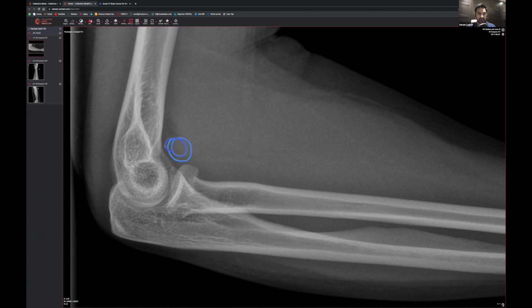But in this particular situation, it's almost undeniable that there is some elevation of some fat, and there's some high density material located here. Now, the other thing to understand is that there is like a bit of a joint capsule like this. Now, if this joint capsule is for whatever reason ruptured, then you may not get this sort of hyperdense material located here, and you may not get this elevation of the fat pad here either, because the fluid is no longer kept within the capsule. It's actually flowing around over here, so you don't get that elevation. But in this particular situation, the capsule is actually still maintained, resulting in this sort of bowing of that fat. So you can see that kind of linear sail-like area over here. And that's happened because that capsule is still present, but there is definitely a fracture.